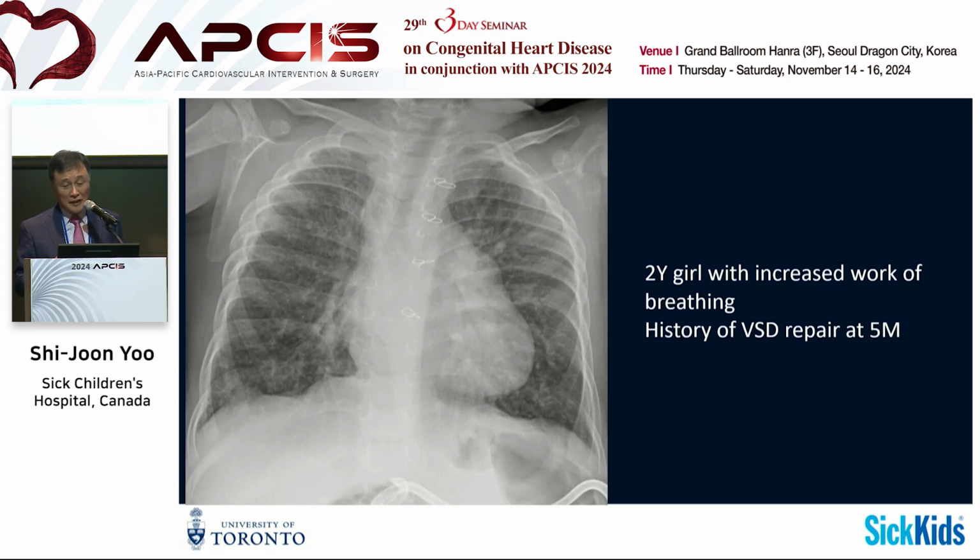A 2-year-old girl with increased work of breathing, history of VSD repair at 5 months. When the VSD was closed, nothing was wrong, but however, she came back at 2 years with some problems. The chest X-ray is very typical. What it is that the left lung has prominent vessels and the right lung has decreased vessels, okay?